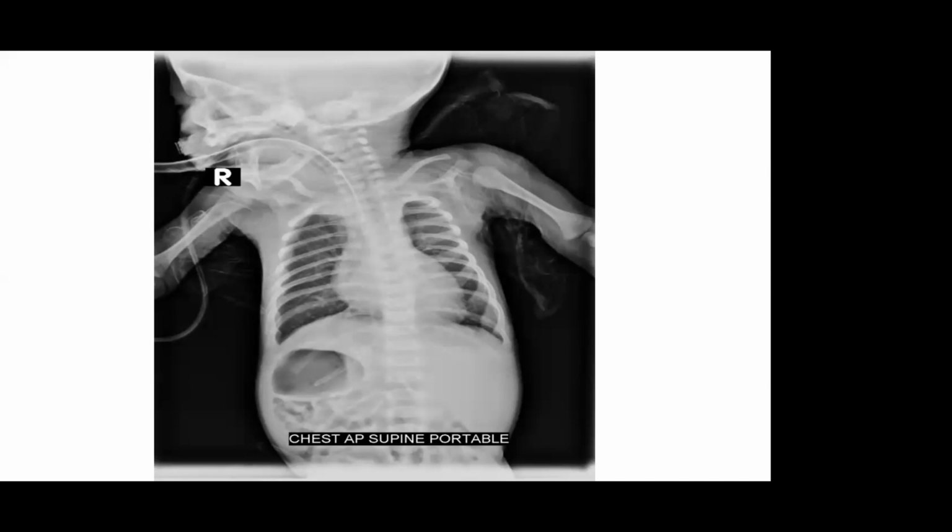Look again. Don't diagnose TTNB. The stomach is on the right side. We presume the marker is right. It's not dextrocardia, so it is situs inversus, but partial because dextrocardia is not associated with it. Don't diagnose TTNB. TTNB is a clinical diagnosis, more a diagnosis of exclusion.